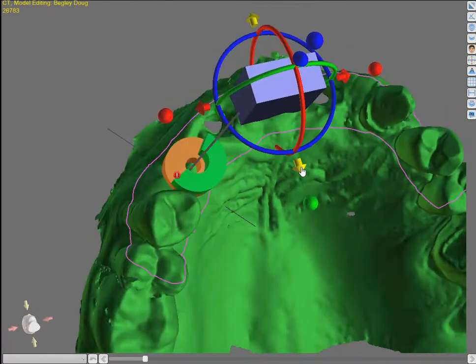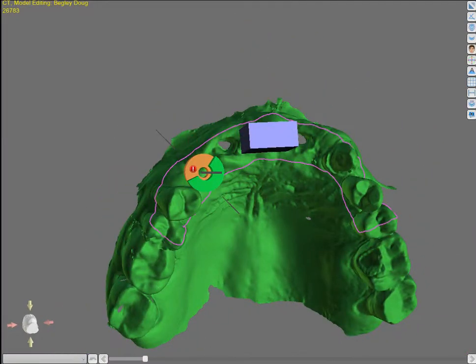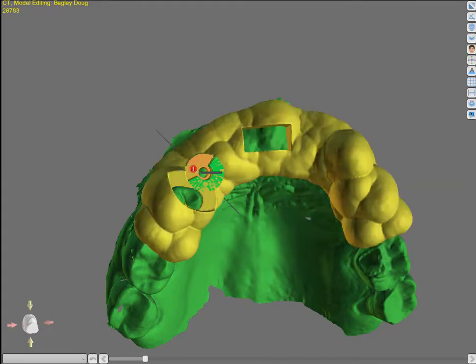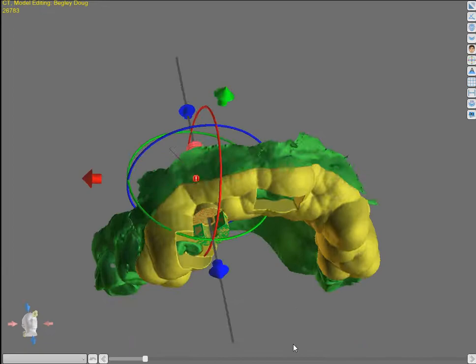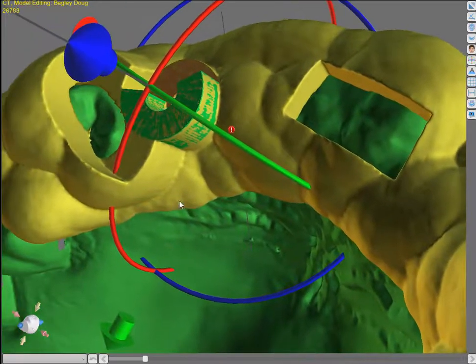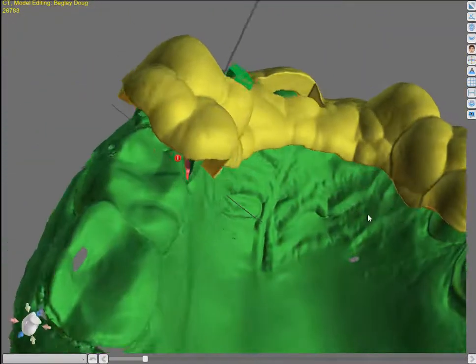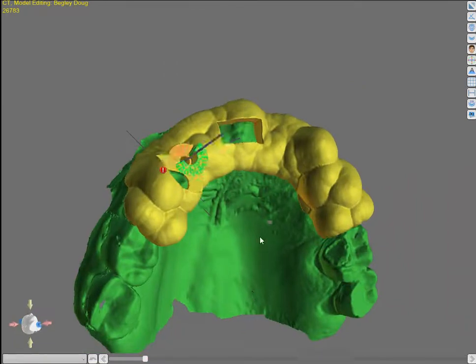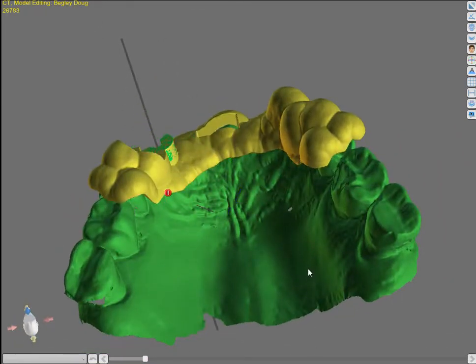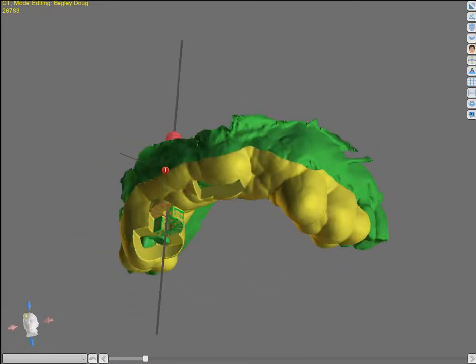All right. I'm going to create surgical guide and let it calculate. So here's our surgical guide, and that's pretty much it. It'll allow me to see its seat in the patient's mouth, and then I'll be able to see its seat on the soft tissue, and this will be the other aspect. We do not need lateral pins for fixation because we're going to be using the teeth as guides. And that's pretty much it. All you have to do is export this guide and 3D print it now.